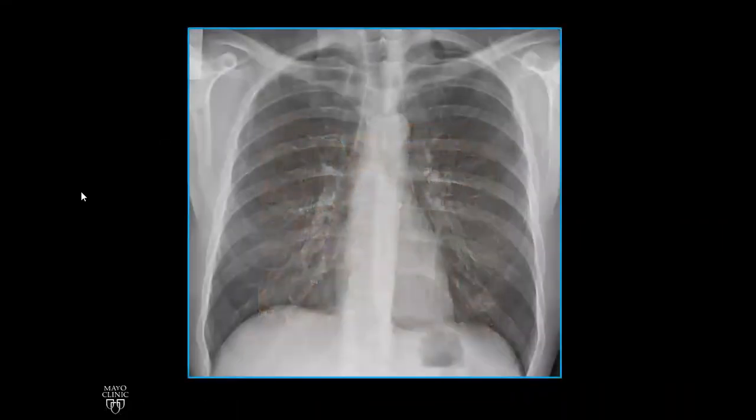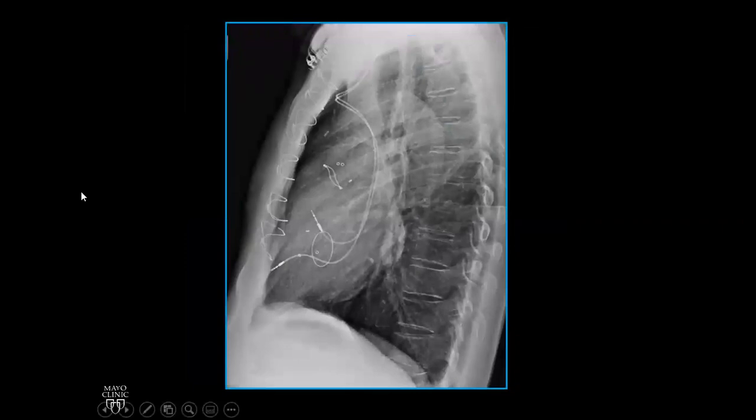And we fill in the frontal radiograph on that patient. This is a different patient. The RV outflow tract lives there. This is a 73-year-old male with carcinoid.